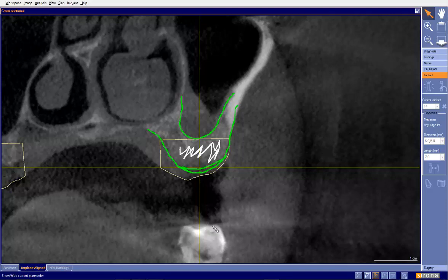As we know, the central groove of the lower, the implant itself, the center of the implant should probably point down towards this buccal cusp. Again, we'll have some CEREC data here to help us. So that's the area that we're looking at to be able to work with.